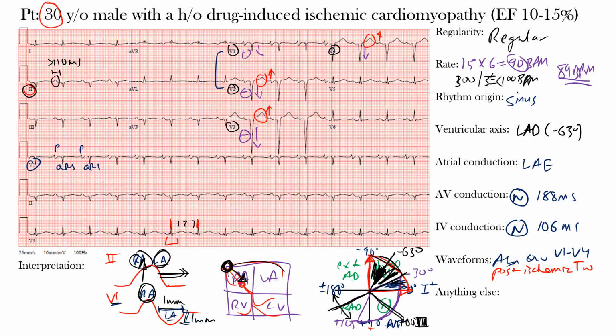Okay, so what we're seeing here is in V2, and here's V3. Notice that it looks like there might be some ST elevation in this case. Same thing here, maybe slightly in V4, and in V2, but it actually doesn't reach that upper limit. So in V2 and V3, we want it to be 2.5 millimeters, which it's not here. And then the other lead, V4, should be at least 1 millimeter, and it's not in this case. So there's not any significant ST elevation in these leads.